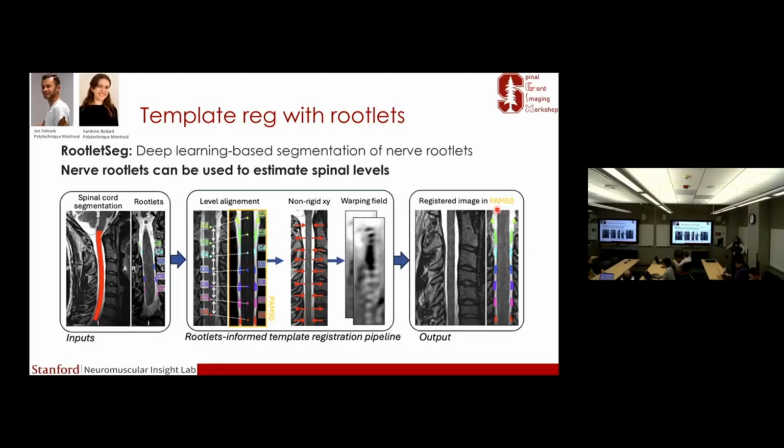But for example, I would assume, if it is above C8, and also this is just one slice, but these are 3D structures. So you can look also at the other coronal slices because they will probably enter a bit more up if you go to the red one at C8. But I would probably assume that a bit above C8 is still C8, just because the rootlet entry zone, I cannot see it.